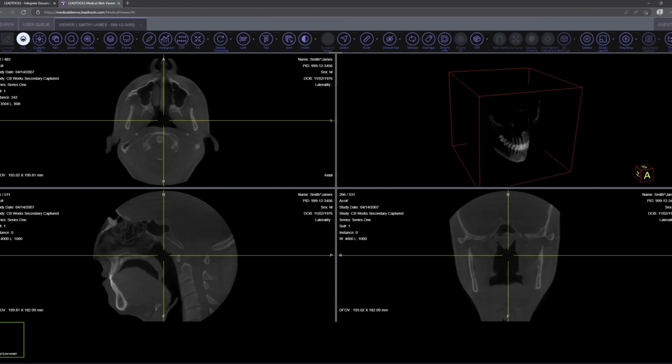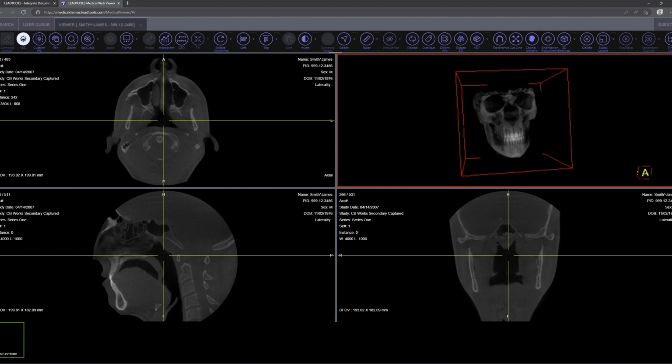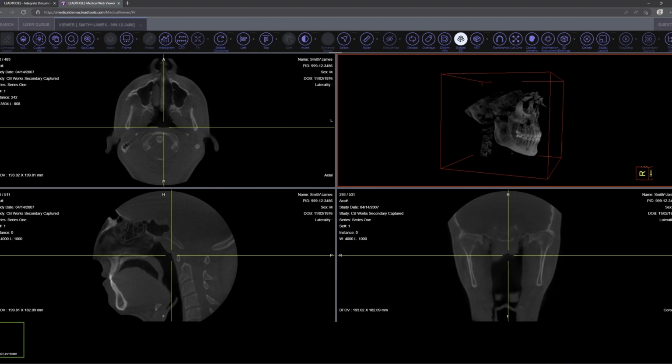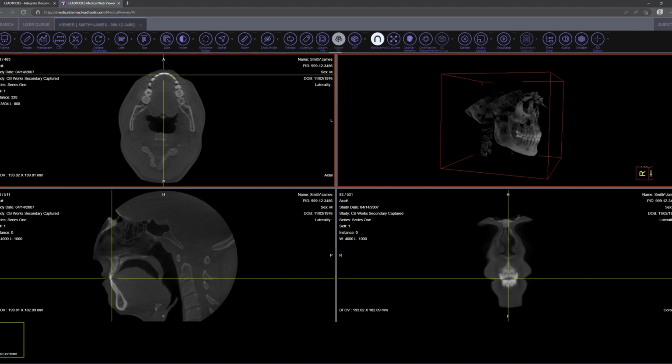These generated slices and reference lines show the 3D cuts of the head, allowing doctors to scroll through the scan in all 3 dimensions. As we move the line on the top left axial plane, observe the coronal frame in the bottom right updating with the corresponding cut of the head. Lastly, we'll create a curved MPR or panoramic slice of the head, focusing on the teeth.